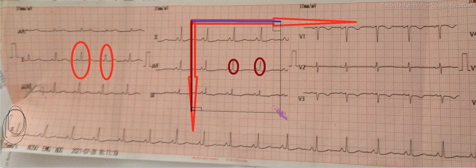So when I draw the resultant, you see the resultant will go in this direction. Let me draw it with a bold one. This is our newly formed resultant vector, the resultant R, and this resultant R vector will show us the axis. You see here, this is 0 degree, this is 90 degree. It is lying somewhere between 0 and 90, which is of course the normal axis. So here the ECG axis is normal. We have also dealt with that. So the vectorial axis is normal.